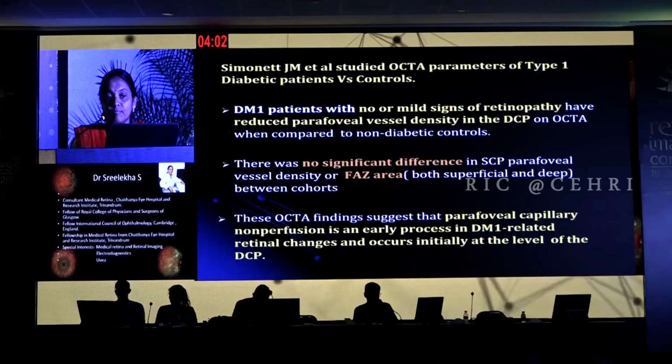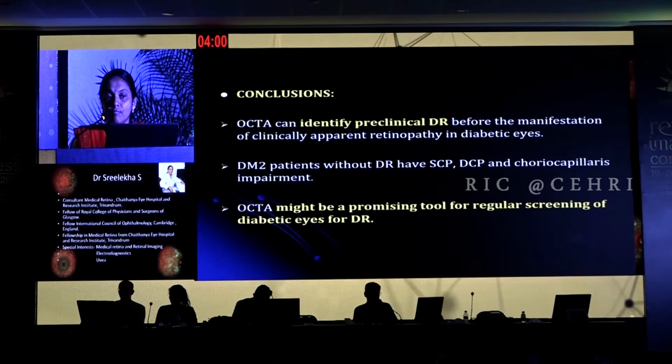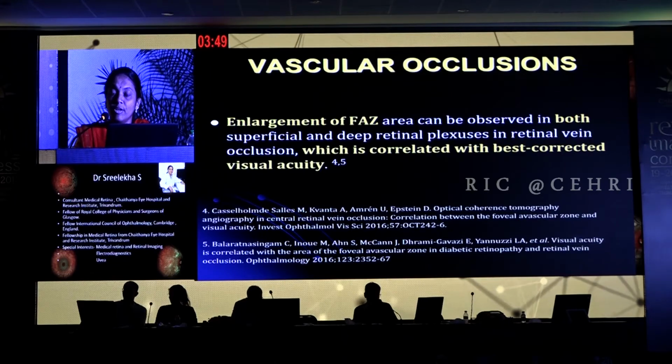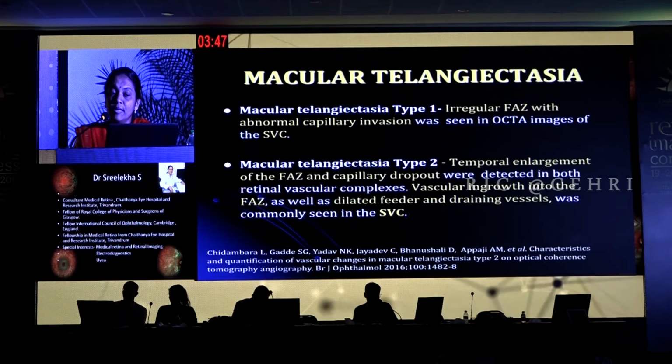I'll skip some slides on preclinical DR. Enlargement of FAZ has also been described well in vascular occlusions that we also very well know. Now coming to the rarer conditions, macular telangiectasia was also discussed yesterday.